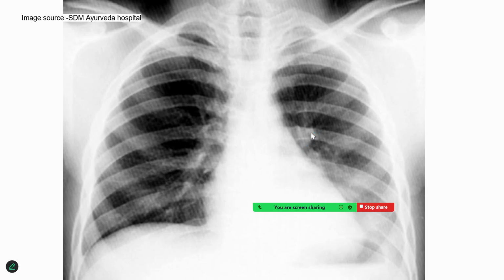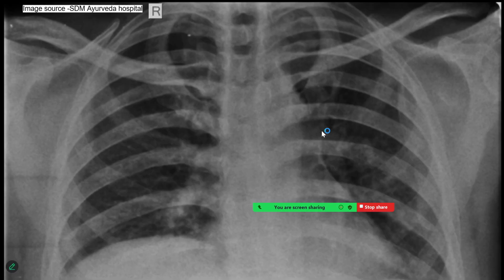Of course, along with that, there could be slight changes in the lymph nodes. Lymph nodes also may be slightly inflamed. Now, as the condition progresses further, these mottling may become more prominent, and their areas could be bigger, which suggests a more progressive pathology. Or even fluid may be filled into some of these tubular structures, the vascular structures also. They also may show some opacity. And as the condition progresses further, it may even lead to thickening of the bronchial area, and the tracheal surface also may be slightly inflamed.